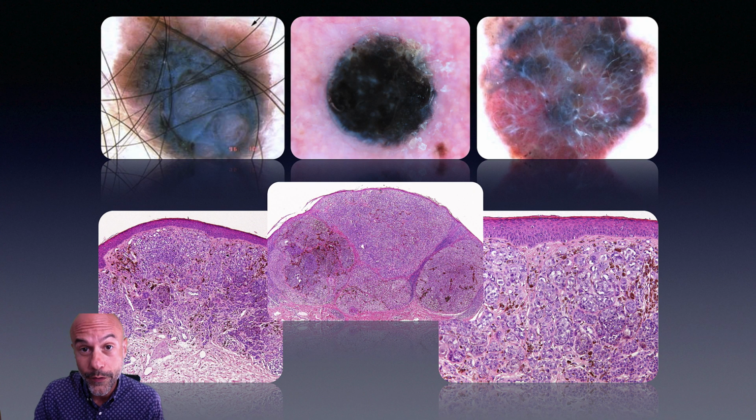And finally, blue color of course can be seen in melanoma because melanoma cells obviously invade the deep dermis in an advanced stage, and therefore blue color might be seen also in melanoma. The difference is, as compared to blue nevus, is that we would very rarely expect the melanoma cells to infiltrate the dermis in a symmetric way. Usually the infiltrations will be much more dense in some areas, therefore intense blue color in some areas and less dense in other areas because the invasion of melanoma is not symmetric, obviously.